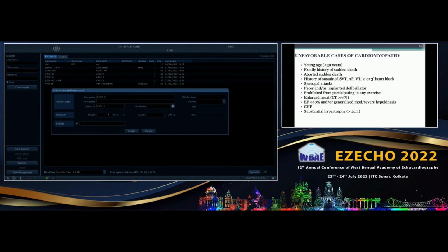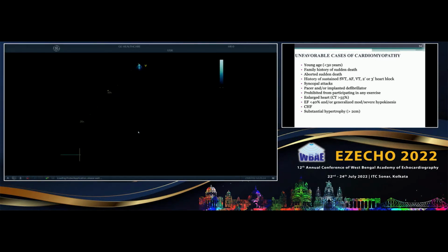Am I correct? Yeah. See, in an ischemic heart also you may get it, but you may get it at a later stage. The problem is there is no hypertrophy. Here, in the presence of hypertrophy, you are getting it. That tells you that this is purely pathological. There is no deformation actually, there is a lengthening in areas. So one part is contracting, the other part is elongating. If you are just given this particular map, it can be anything. This map in the presence of your 2D echo image of hypertrophy, then you know that this is HCM. Not just given a GLS map and saying whether it is HCM, it's not so, because even in some dilated cardiomyopathy you may get something like this.